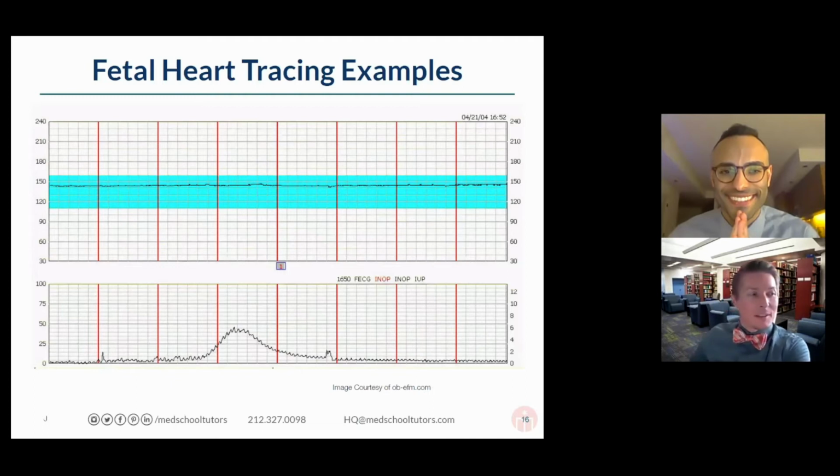Okay, I see somebody saying what is happening potentially here. So I'm going to give some credit to Jotan here. This is potentially a fetal sleep cycle. What did we say earlier about fetal sleep cycles? What would I say about the variability of this heart rate, given that we think the baby might be asleep? There we go, there's the answers.